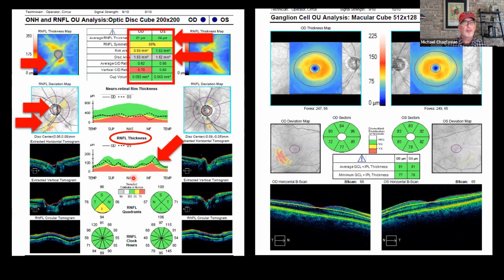so that you can make your most definitive diagnosis. It's helpful to inspect the circumpapillary RNFL scan or B scan down on the bottom of the page. It's not very well displayed on this report. It's not large enough for segmentation failure. So when the OCT is identifying the thickness of the retinal nerve fiber layer, it sometimes doesn't do it correctly.